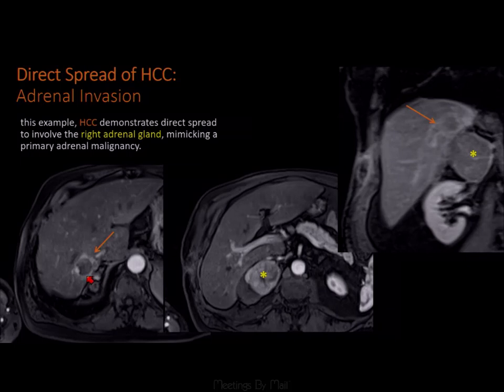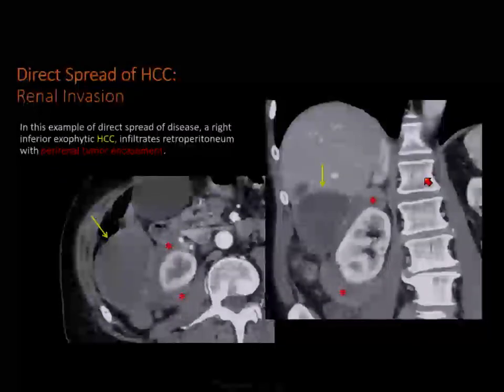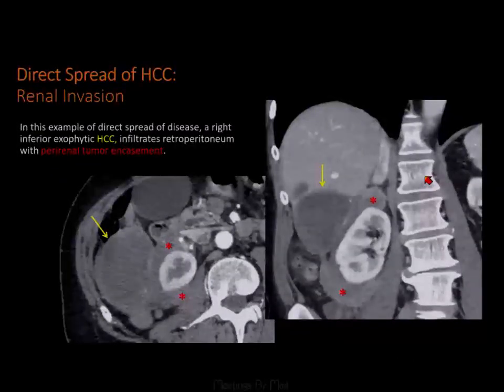the treatment phase, the nodular portion of the tumor actually extended into the retroperitoneum, and this was a case where the recurrence actually involved the adrenal gland. The previous case wasn't actually metastasis. We could see on multiple sequential imaging that it was growing into the adrenal gland.